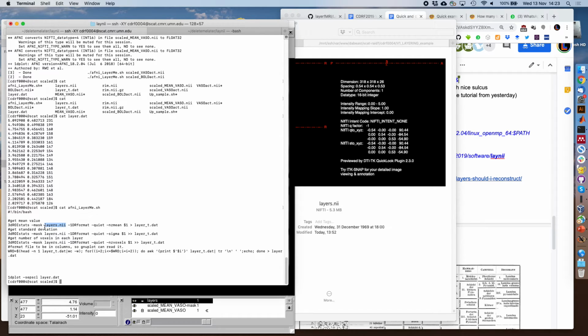In fact, 2D might even be wrong. If we have a sulcus like that and you cut it here, then who knows what you get. The cortex is 3D, so we need to do it in 3D. Or with these weird things, it could be that we have white matter in the third dimension, and it all makes sense.